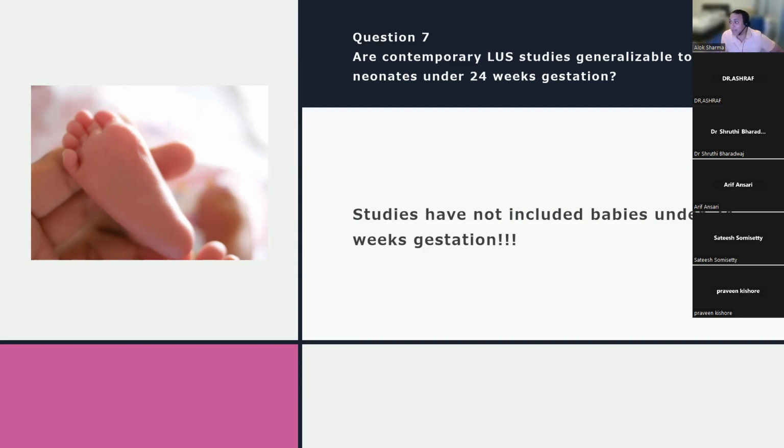I have seen well aerated lungs in a baby at 22 weeks of gestation after the first dose of surfactant, with a double lung point, with pleura that is well established, with no evidence of atelectasis. And that baby was in about 30-35% FiO2. Now, again, the question I'm really asking myself is, I've treated the RDS, what else is wrong with the baby? And really, when we did an echo, the duct was shunting predominantly right to left with a significant TR gradient.